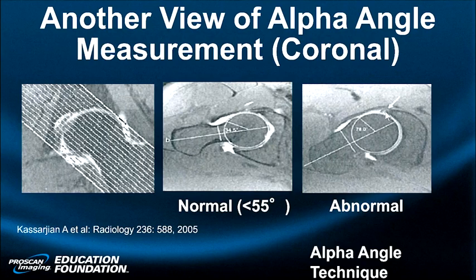And in terms of anterior fissures regarding the labrum, it is very common in normal individuals who are adults to have posterior labral tears all day long, just like we see them in the shoulder. They may be minorly symptomatic or they may be asymptomatic. It's the anterior ones that are symptomatic, and particularly the anterior traumatic ones, the ones with cysts, and the ones with arthritis right in the area of the labral tear.